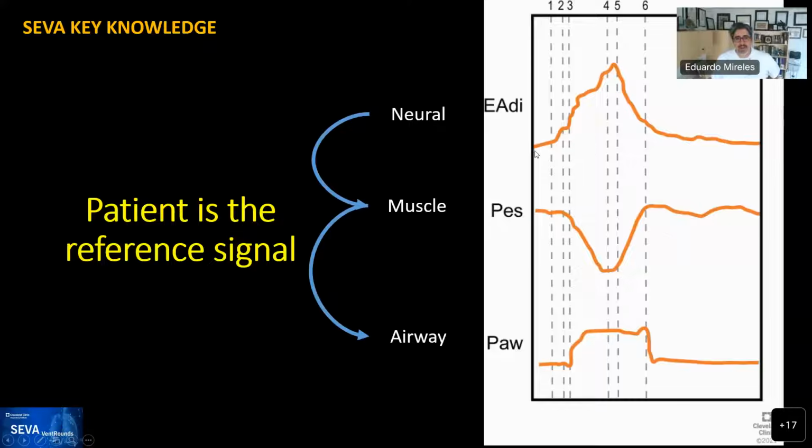There may also be, in certain circumstances, an electrical signal not the same magnitude or duration as the esophageal or muscle signal. That's a little more complicated, but just to make you aware, this is called neuromechanical uncoupling, meaning that the signal from the brain and the signal from the muscle are not matching.